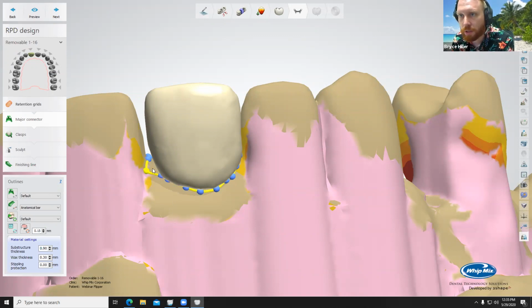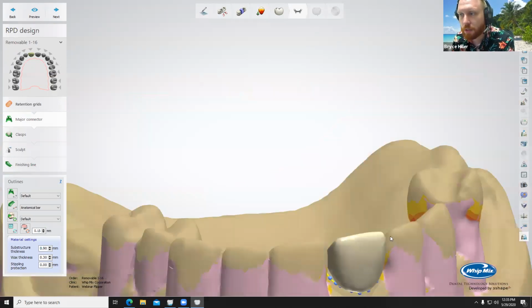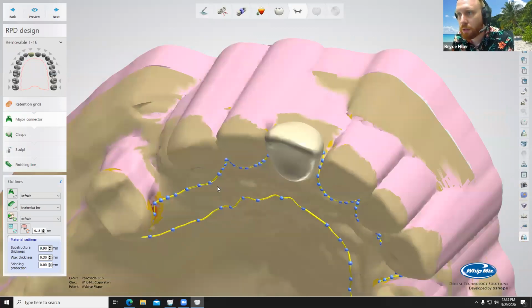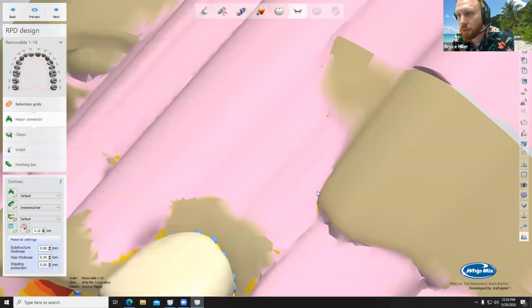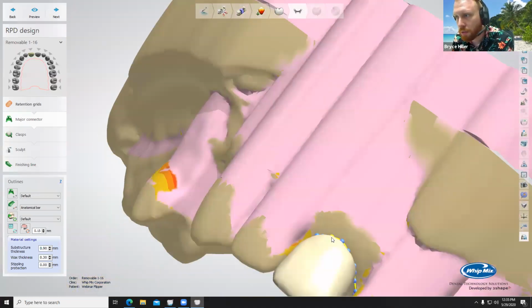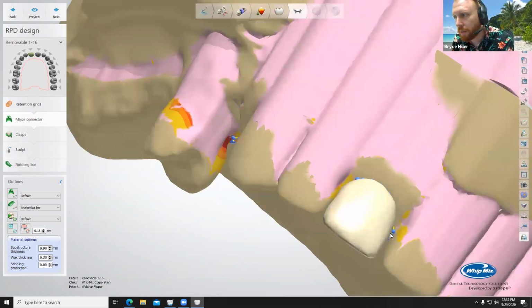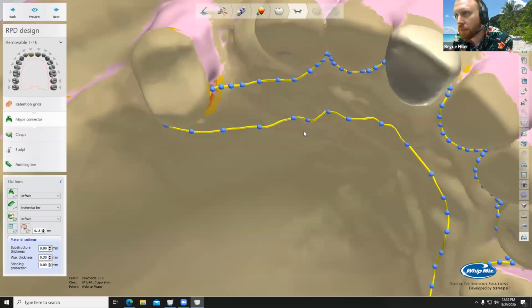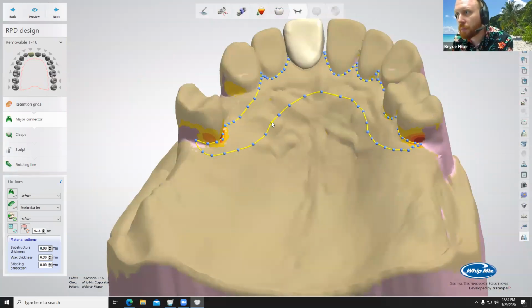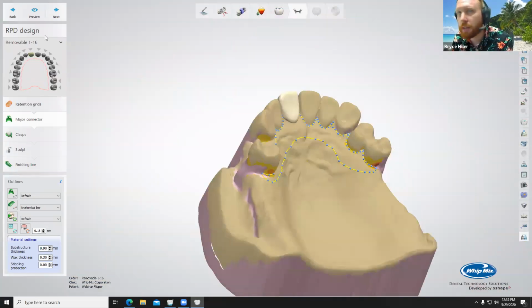You really could just bring this right underneath it like that. Just like that. Let's go ahead and preview it.